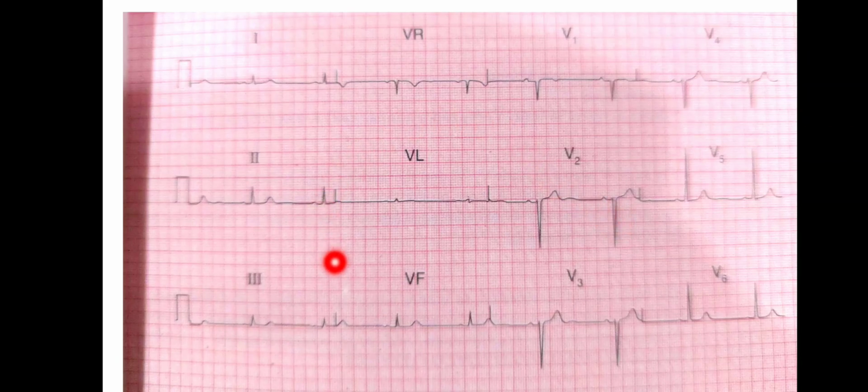And despite the absence of the Q waves, this probably indicates an old anterior wall infarction. As I have told you, leads V1, V2, V3, V4 are the anteroseptal leads. So whenever we find poor R wave progression, we can comment on the ECG that either this is an old anterior myocardial infarction, or, what could be the other explanation for this? It can be due to poor lead positioning.